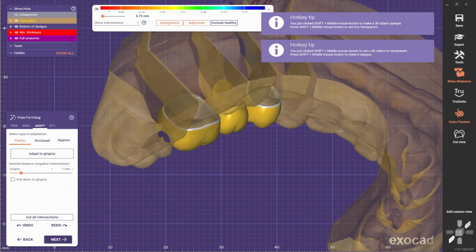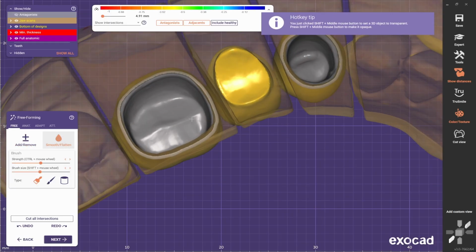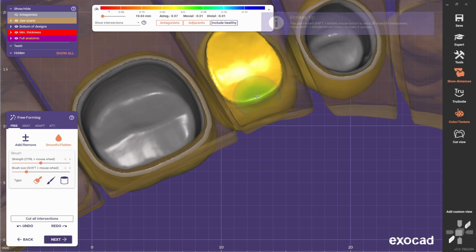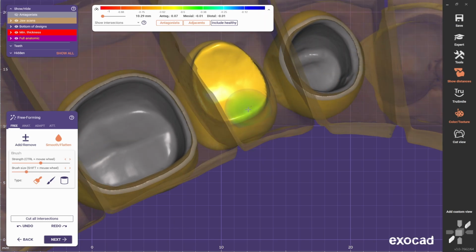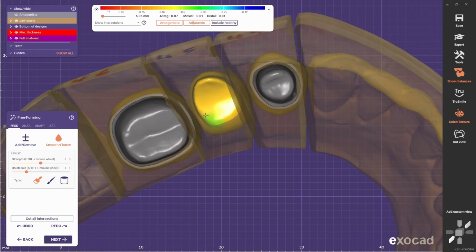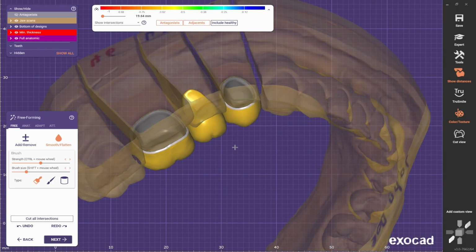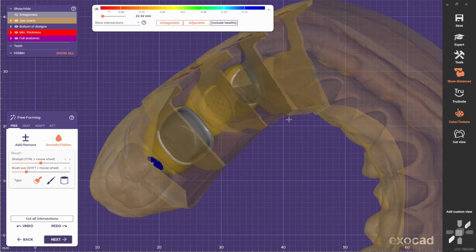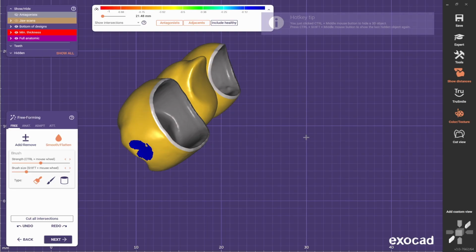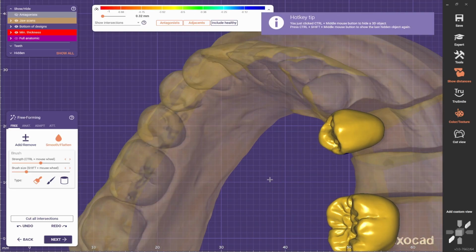looking concave, and the Pontic should never look concave. We need to make, for this case, probably a modified ridge lap. If the client asks you to do an ovate Pontic, you would do much more pressure, but I don't think this soft tissue could accommodate that.